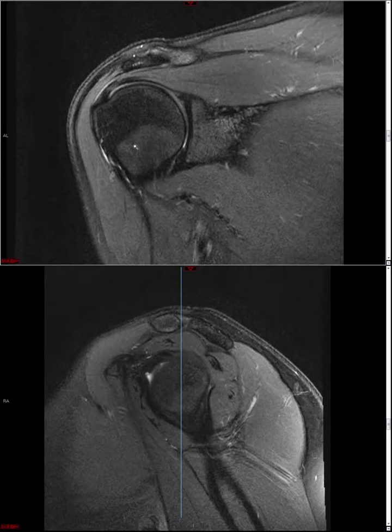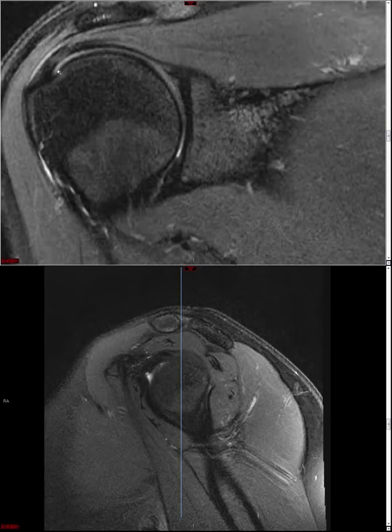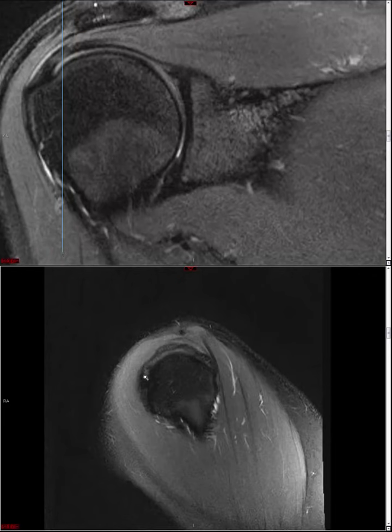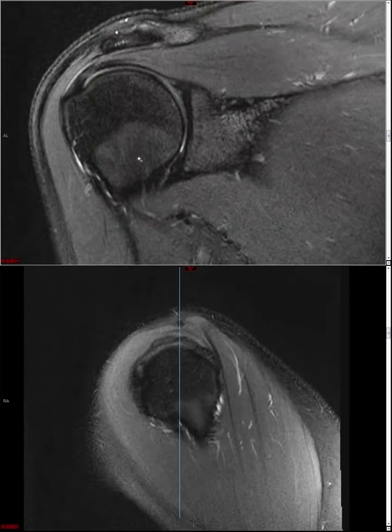So we said supraspinatus, and then you should say if the partial tear extends to the articular side, so if it communicates with the joint side of the tendon, or if it communicates with the bursal surface fibers, so a bursal-sided tear, or it might actually communicate with neither, and it's a so-called intrasubstance tear, which potentially could be occult at arthroscopy, so that's important to note as well. So is it articular-sided, bursal-sided, or intrasubstance? Then you should, of course, give measurement of the tear in 2 dimensions, anterior-posterior, medial-lateral, on your sagittal and coronal, as we talked about for full thickness cuff tears.